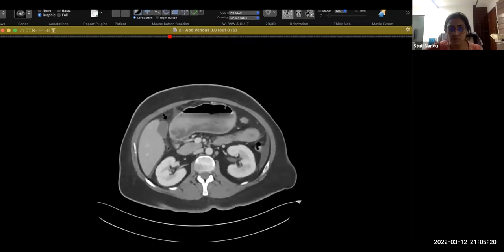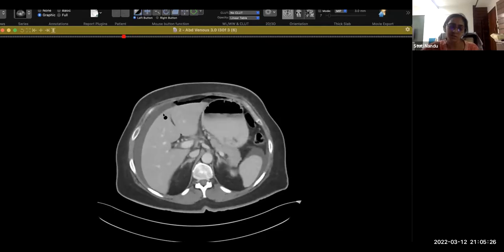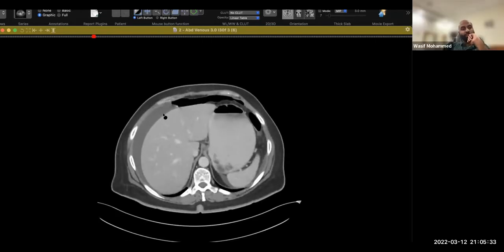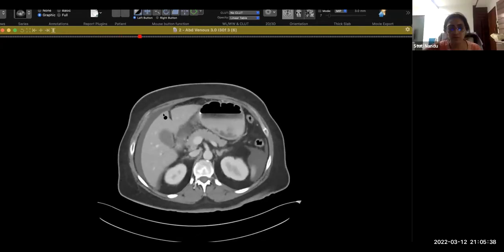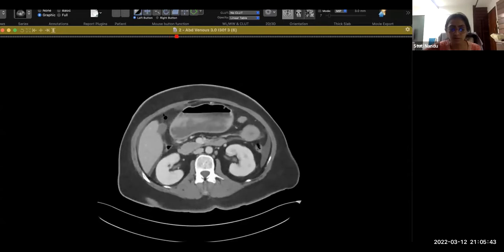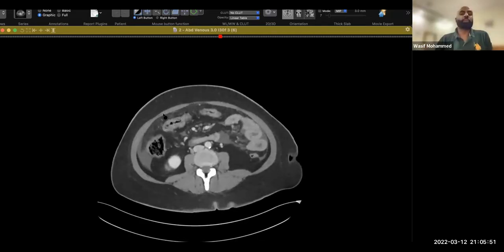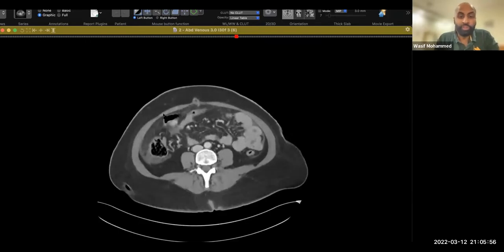I would like to inform the referring clinician and suggest a gastroscopy. The surgeon is not convinced that it might be a peptic ulcer. So is there any way we can confirm this? We could do an endoscopy to look at the site of the duodenal ulcer. I mean by radiology, because he doesn't want to waste time doing endoscopy when it could be a diverticular perforation.